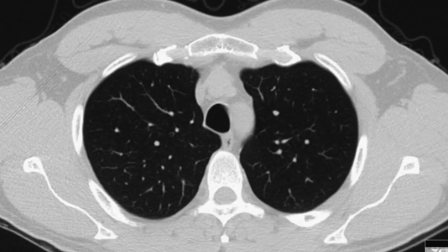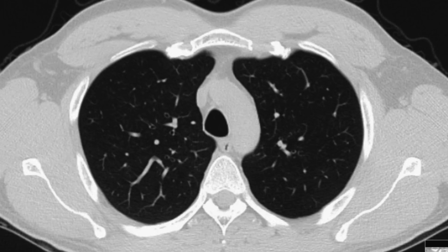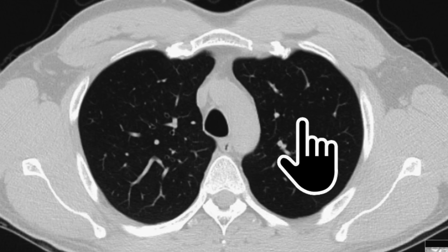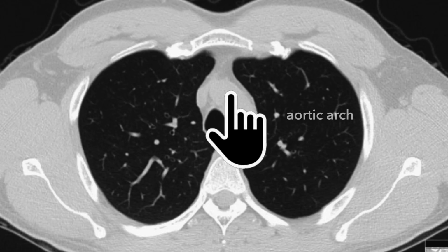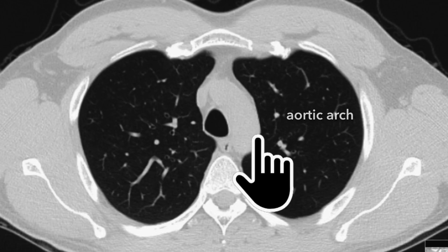Now I want to go the other way, probably. All right, I'll tell you what I do. If I see that level, and if you look at radiographs a lot, you'll get used to this, but if I look at that level, I can see, ooh, aortic arch. Great landmark for me. This here, this is the aortic arch. And that then is the superior vena cava.